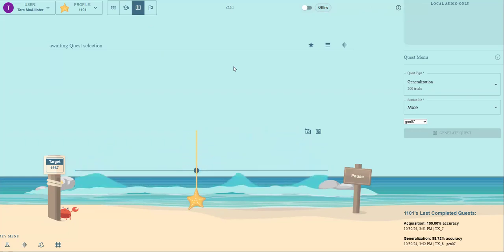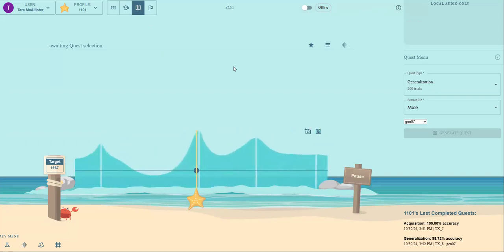For the LPC wave, the speech signal is analyzed on the client's local device and transmitted via WebSocket technology, which redraws the spectrum on the clinician's screen with no loss of frequency resolution and minimal lag.